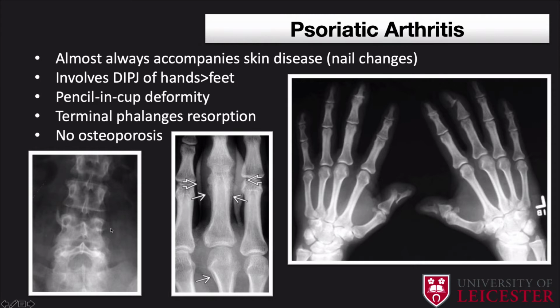So here we've got psoriasis in the spine, where you've got these non-marginal syndesmophytes that are present. This PA radiograph is quite a good example of what we call a single ray pattern, with this periostitis, which you can get with soft tissue swelling, which is quite big and actually overlapping the other joints. And then you've got this cartilage narrowing with the adjacent periostitis along the shafts, and this is quite classical for your psoriatic arthropathy. Any other specific features?